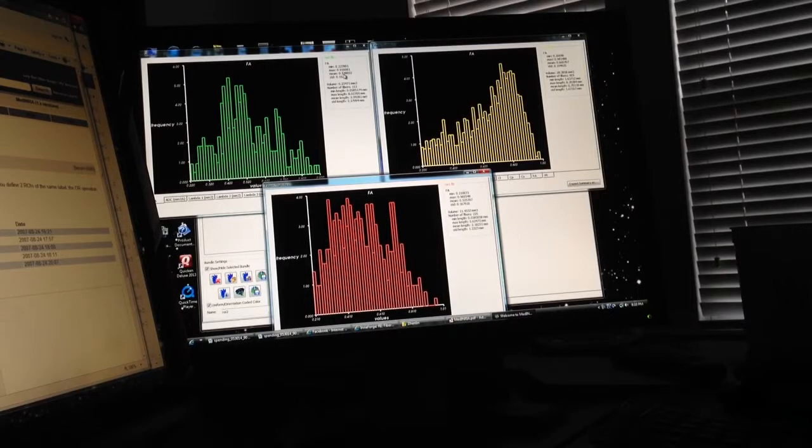Your min, max, mean across that entire set of bundles. It gives you the volume of the bundles. You'll notice that for the regions where we had a lot of fibers, the volume is bigger, and smaller for others. The number of fibers gives you something to compare between healthy and diseased areas. Min length of fibers, max length of fibers. Anyway, I think this is going to give you the statistics that you want.